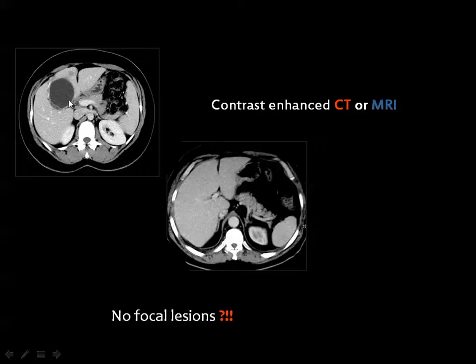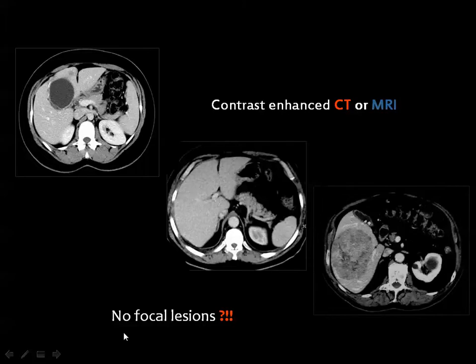Then if you look at the liver and you see a lesion which is containing water or fluid, this is known as a cystic lesion, and the lesion which is containing solid material like this is a solid lesion. In the lecture of hepatic imaging, this is a very important diagnostic finding in order to identify or to diagnose hepatic focal lesions. You should first identify whether the lesion is containing fluid or the lesion is made of solid material.